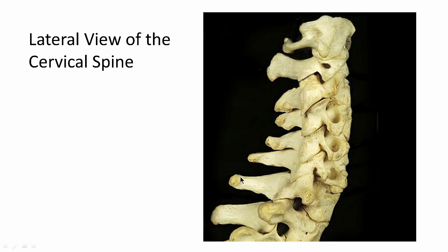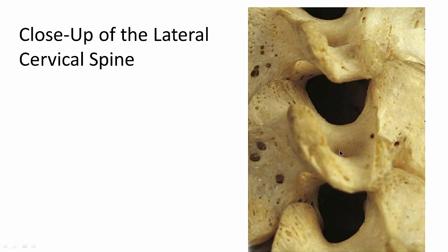Let's see. Spinous processes would be here. Lamina would be here. You can actually see a very nice line, the spinal laminar line, on radiograph to show that better, but it would be right in here. Transverse process. You can see it. Transverse process is actually quite complicated. Let's go to a bigger view here. I think I have a blow-up view.